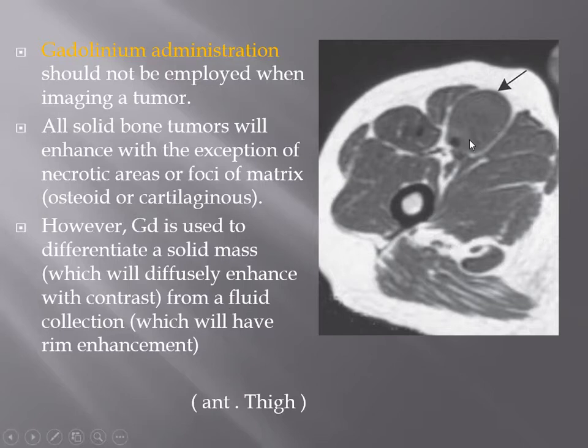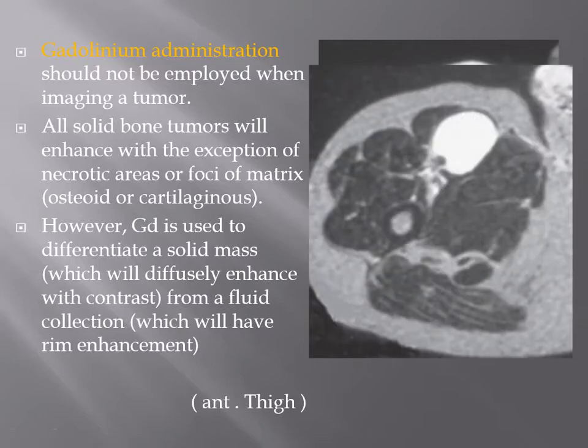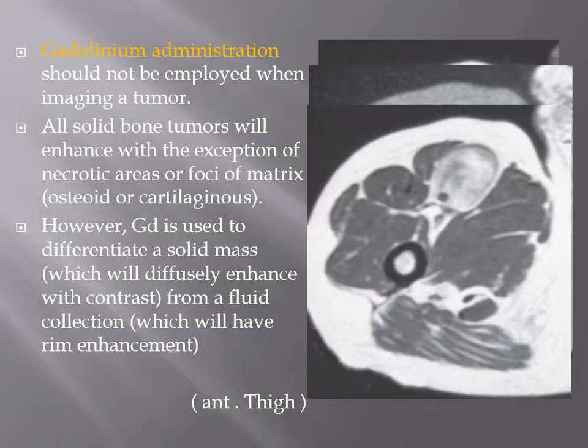This is an example of a lesion that is well defined, seen at the anterior thigh. On T2 fat sat, it was very bright signal. We can say this is almost fluid. However, after giving contrast, it has a heterogeneous enhancement, and it proved that it is a schwannoma.